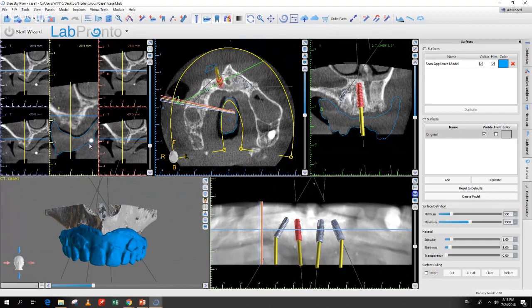The outline of the model should wrap tightly around the marker that was in the patient scan. So to summarize, the merge was done properly, but either the denture doesn't fit the patient or wasn't properly seated in the patient's mouth.